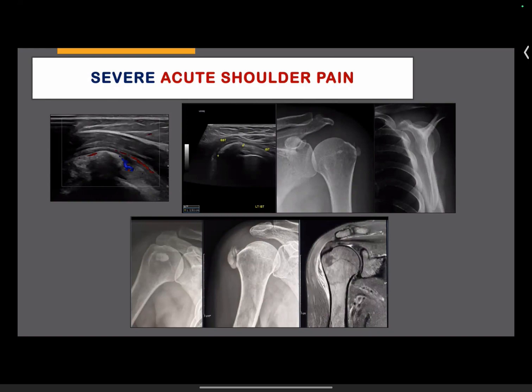And then if X-ray is available, fair enough. If not, when you scan them, you see this kind of cloudy density with ghostly shadowing at the back. And occasionally, if you put color on, you can see active tendonitis. But most of the time, what you find is acute active bursitis, which gives them the grief. So this is another case. If it was a few months back, the calcific deposit was there, hydroxyapatite, and then a few months later, when the patient presented with an acute episode, you can see it has slipped off. It's lying in the bursa and causing all that florid chemical bursitis, which gives them a lot of grief.